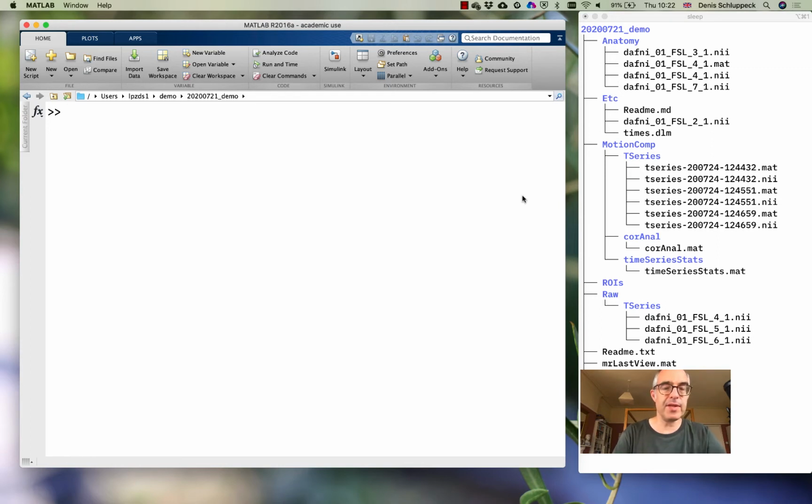And we routinely do segmentations on those with FreeSurfer, although people sometimes use Carrot and other tools too. But FreeSurfer is a go-to tool. For this participant, for which we have this sample data set here, I have run a FreeSurfer analysis. There are some important details here. The output of the FreeSurfer segmentation can be converted into a convenient format for aligning things to in mrTools. I'm providing those files and some details on how to get to that point with your own data sets on the GitHub page as well.